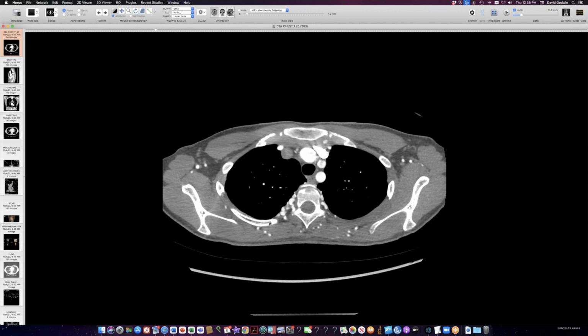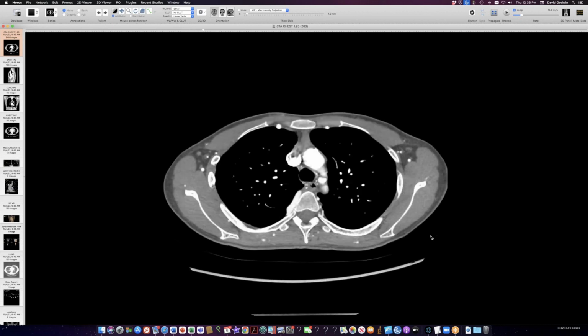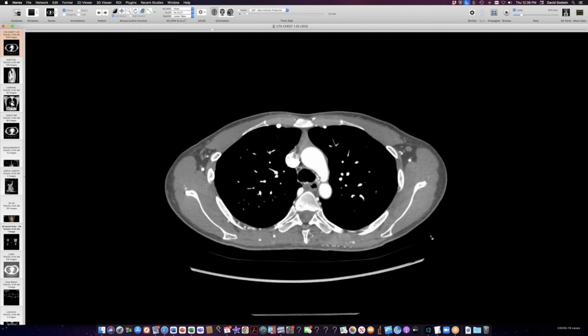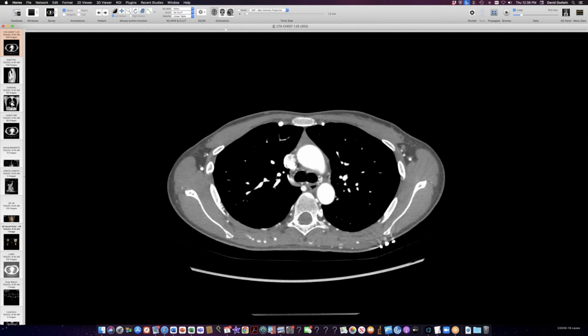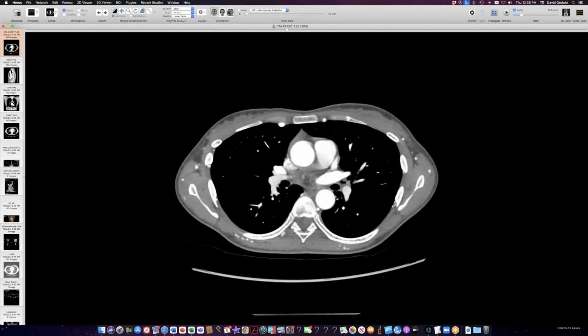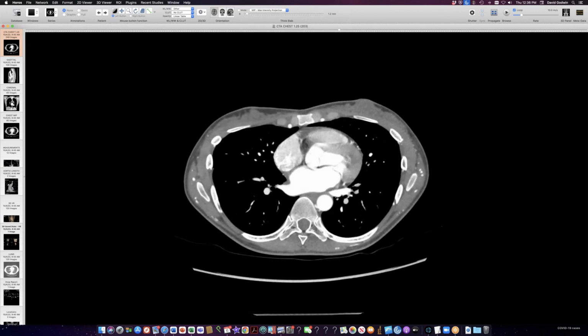But in this situation where the descending aorta is not being properly fed, the blood flow in the posterior intercostals, the cause of the rib notching, is actually retrograde. It's picking up blood from the internal mammary or internal thoracic. It's going in anterior intercostals, which connect with posterior intercostals, is forcing blood retrograde into the descending aorta. But you can see the snaky collaterals here in the paraspinal region.